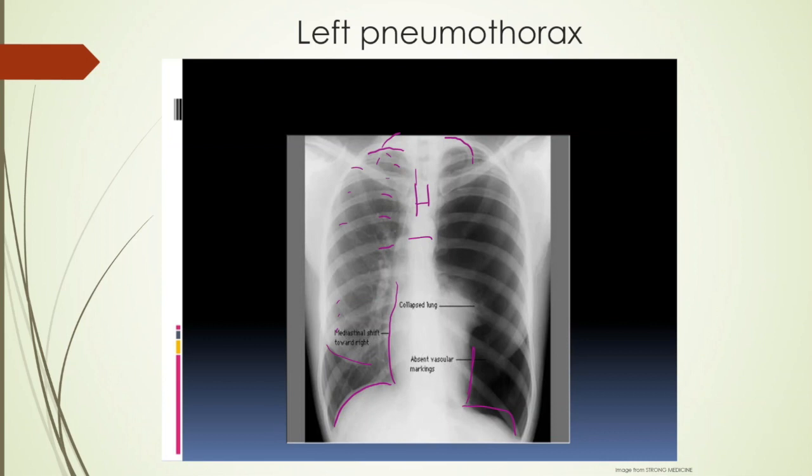Oops, sorry, my computer was going crazy there. And so E for everything else, back to the patient's left side. You can see there's really no vascular lung markings anywhere in here. So you have a pneumothorax, and again, you see a little bit of a shift of the trachea. So there's some tension on there. So I would not be wasting much time in getting a chest tube in this patient. Again, you can kind of see the lung there.